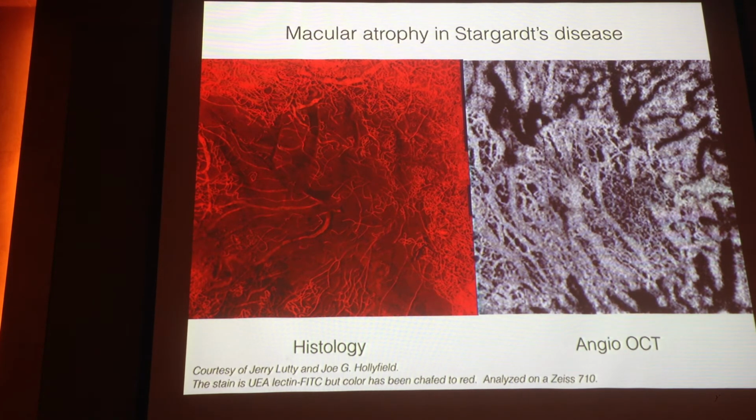So, just by getting some patients and seeing the difference between the presence or absence of choriocapillaris and Sattler layer, you can easily do the differential diagnosis and start to think now about two things.